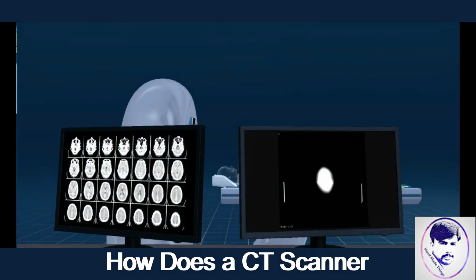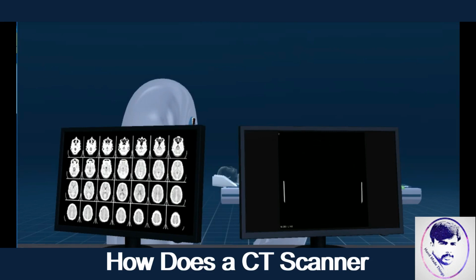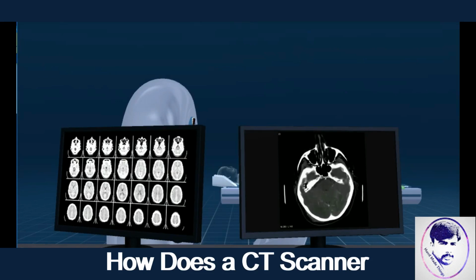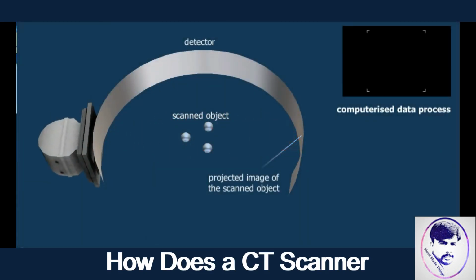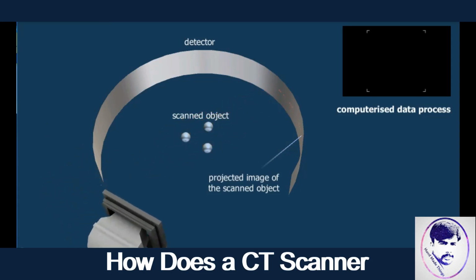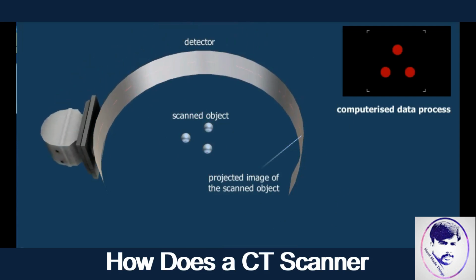In CT scans, the areas that absorb radiation to the greatest extent appear white, while those that do not absorb X-rays show as black. Bones are seen as white, air appears black, soft tissues are indicated by shades of light gray, and fat is shown in dark gray. Computed tomography is commonly used to examine the head, the chest, the abdominal organs, and the blood vessels. With the help of this imaging technique, it is possible to diagnose medical conditions such as strokes, brain tumors, and arteriosclerosis, as well as abdominal tumors.